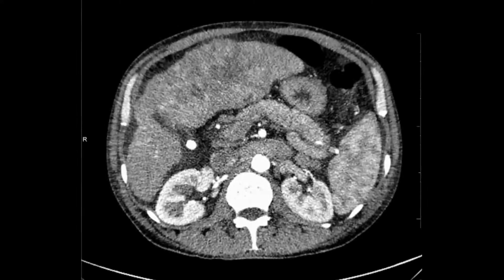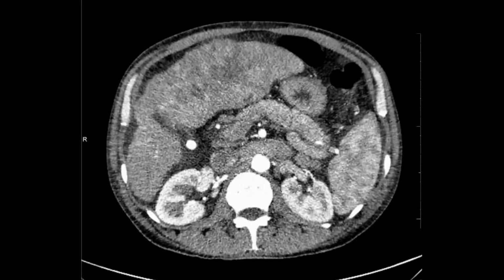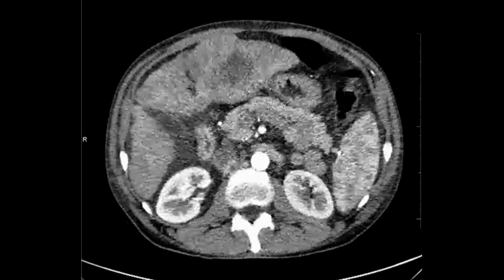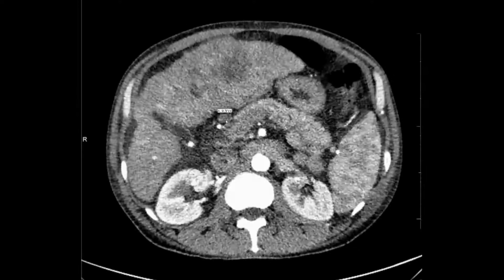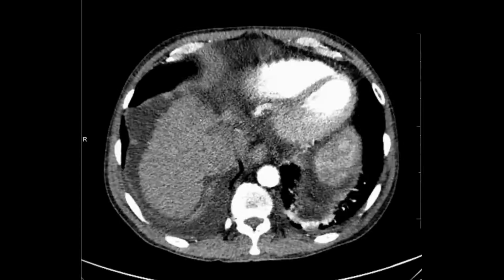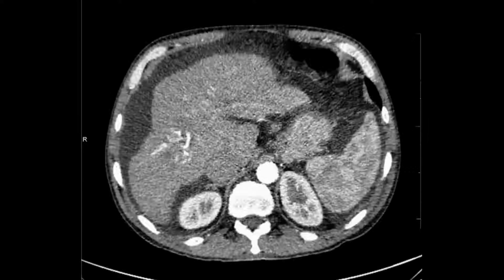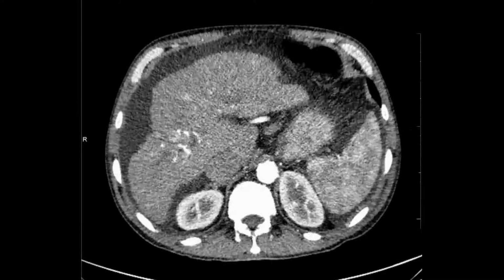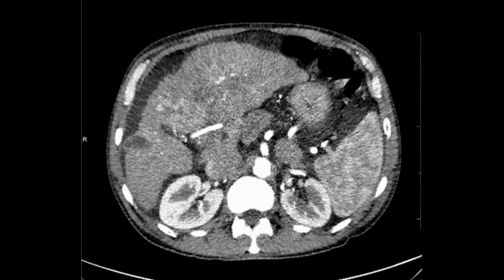Here's that portal caval lymph node that's kind of elongated. It's not as round, but this one certainly is abnormal in the same position that they had here. And given the extensive tumor, I would imagine that we're having local nodal disease. And if you look here as well, you're going to see a lot of satellite nodules. I've found in practice that if there's portal venous invasion, satellite nodules are going to be very common, just because I think it's a good route for the disease to spread.